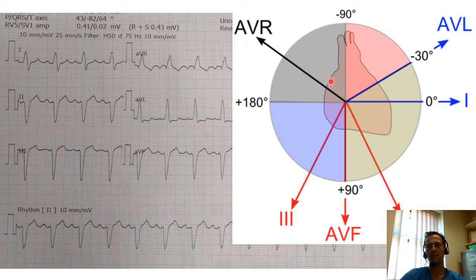And so aVR is almost always inverted, and for it to be positive, we would be looking at the rhythm originating in the ventricle typically and then going up into the atrium. That's the only reason this signal should be predominantly upwards. But rarely you can see this sort of extreme axis deviation, which is definitely conducted through the AV node because there is a very clear relationship with P waves and the QRSs.